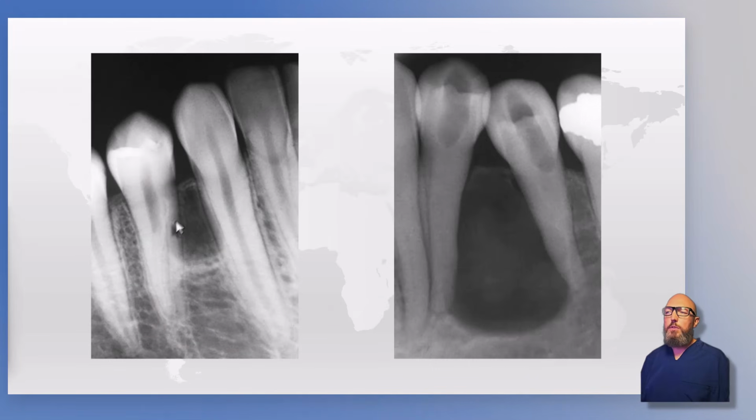All right, this one, that's the right location. Remember, this is our location lecture, so that tells you a lot. You see the mandibular premolar, you should start thinking, is it a lateral periodontal cyst? Is there a reason this could be a lateral radicular cyst, meaning an inflammatory cyst from one of these teeth? I don't see caries, I don't see fracture. Let's say the patient doesn't report a history of trauma, then that might be lower on the list, and you'll have lateral periodontal first. Here's one that's expanding, and it's pushing out the roots.